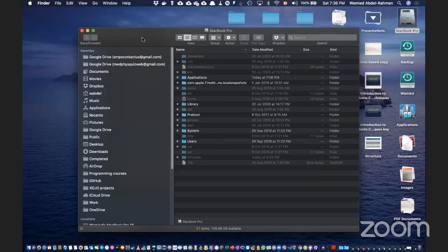What if we actually have both EGS and MMCTP on the same machine? You could. It doesn't matter. Do we still have to configure vsftpd? I think you will have to. Okay, but can we just direct the directory, the folder which contains EGS, to this? Well, it's the configuration of MMCTP. You're going to see it now. You're going to see why you need it. Okay, but you will probably need that.